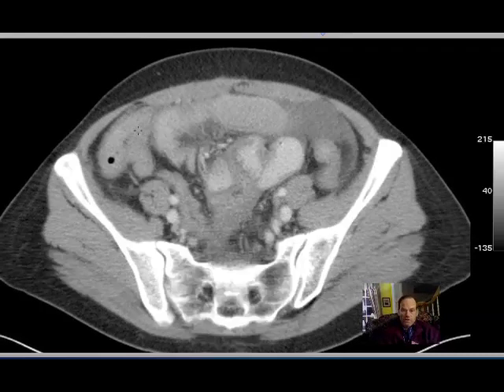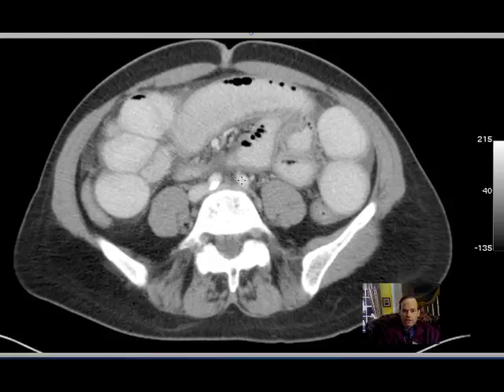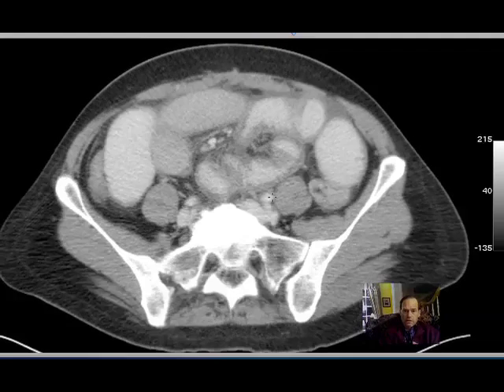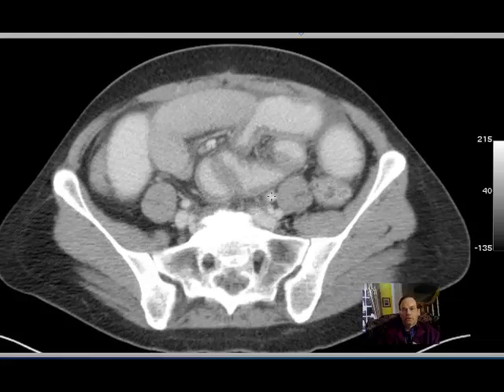All right, so here we go, looking at the abdominal aorta bifurcation. Follow it here, left and right, big chunks of calcium. Watch your diets, folks. And here, okay, there we go. So here's the left common iliac artery, and then right at that point it branches, left external, left internal, and internal is usually quite a bit smaller. Left external iliac artery, left internal iliac artery.